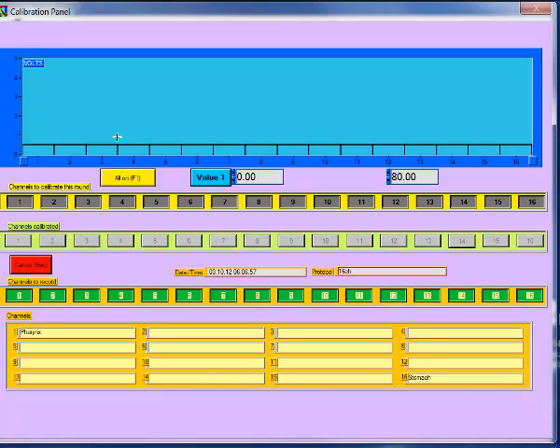When you turn the channels to calibrate on, the current voltage input from the preamplifier is displayed in the graph at the top. The black bars should move up and down when you apply pressure to the calibration manifold, and this can be a useful screen to check during troubleshooting if you suspect a problem with the recording system. The two values that will be used for calibration are shown in the number boxes. Usually these are 0, which corresponds to atmospheric pressure, and 80 mm of mercury, but you can adjust these if required.